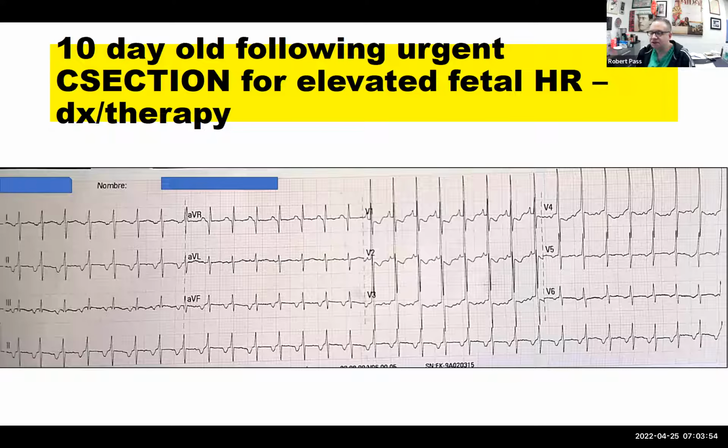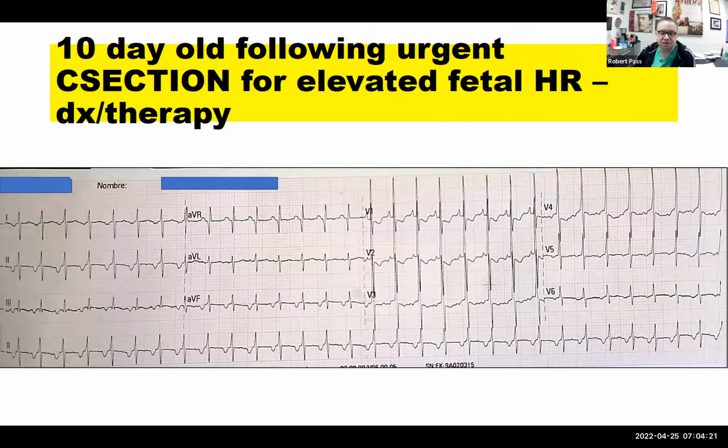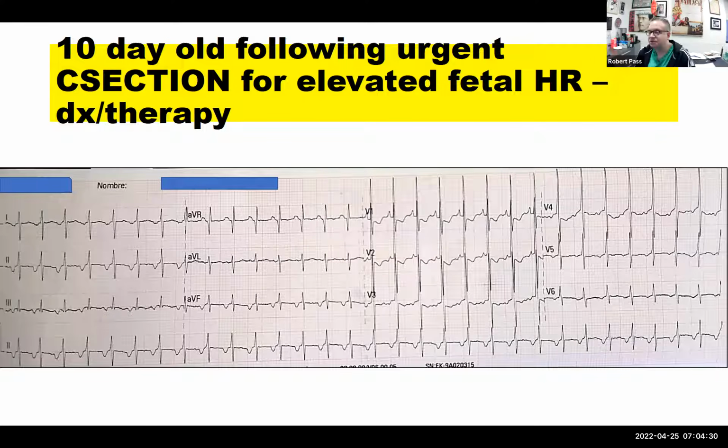What is the QRS to P wave interval in this patient? It's long. Very long, right? Like how many milliseconds is it about? So it is at least one big box. So it's at least 200 milliseconds, right? 200 milliseconds. So PJRT. Yes, it could be the diagnosis. It could be PJRT. So you're right. The differential of this would be either PJRT or ectopic atrial tachycardia.